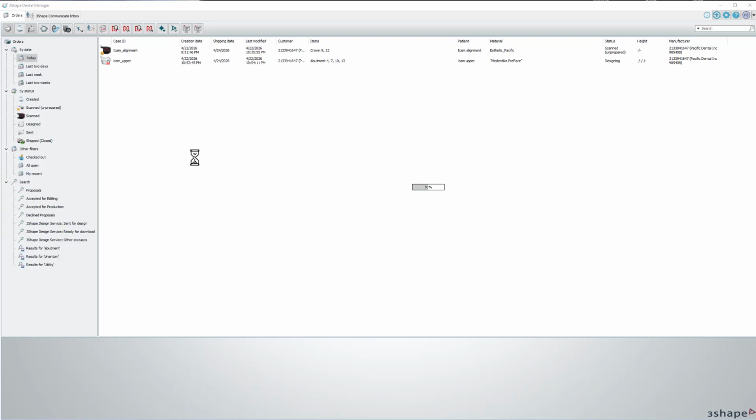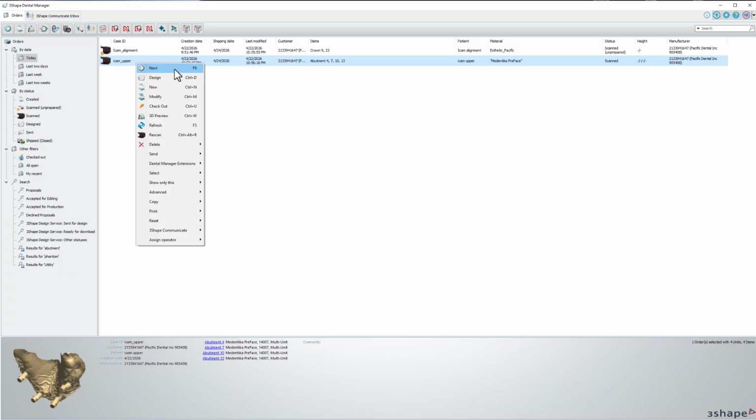Now there's a little trick. There's ways to import this stuff. I watched it on my friend Austin's video, and he did a quick Icam video, and it was very vague. I was like, I don't get it. How did it just work like magic? But you didn't see in the beginning how he got all that information aligned.